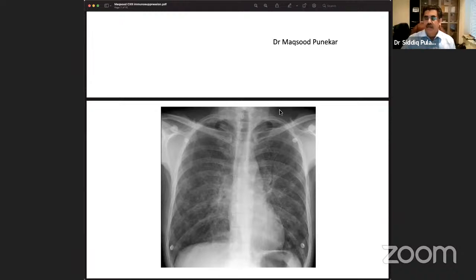Okay, that's right. Now again, coming back to the lateral X-ray, you gave two examples. One, I think one of the first cases, where the patient had a right lower lobe pneumonia which was not seen on the PA view.